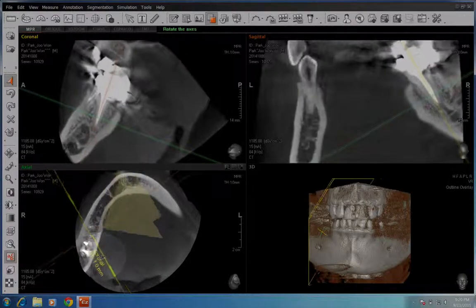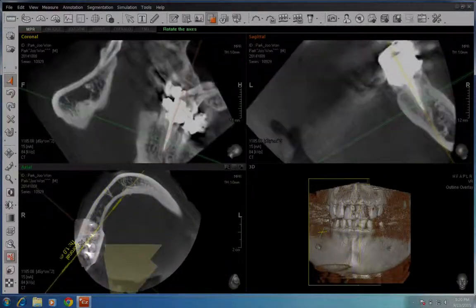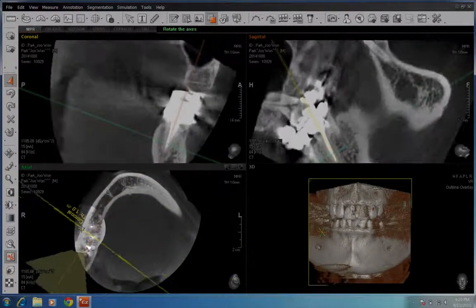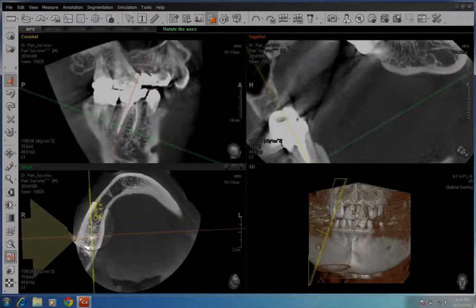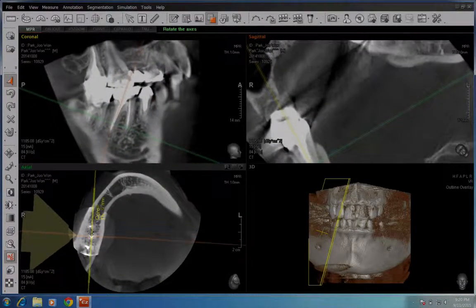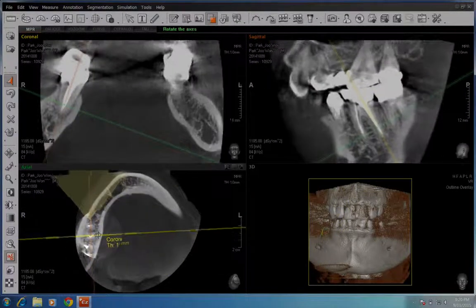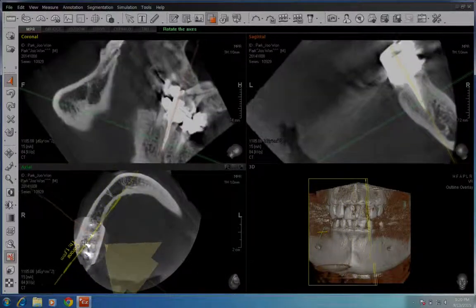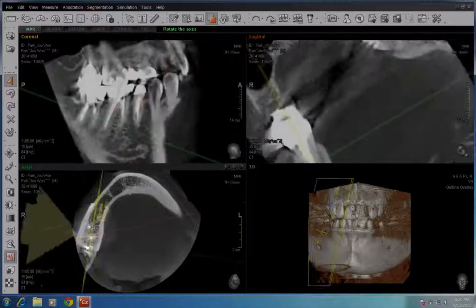And now if you look at either the top coronal view or the sagittal view, you can have a very clear shot of this root, and you're basically spinning around this root in 360 degrees, and what you're looking for is either a fracture or an oblique bone loss or a blip of bone loss. Okay, and so this is another way of determining fracture in the root.